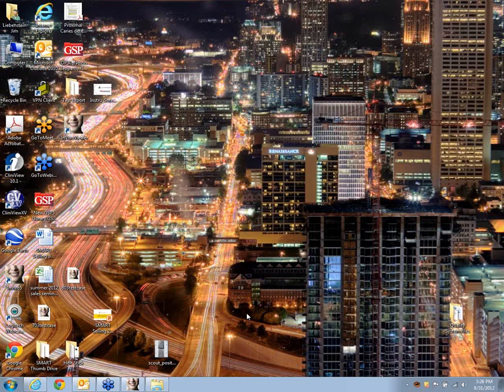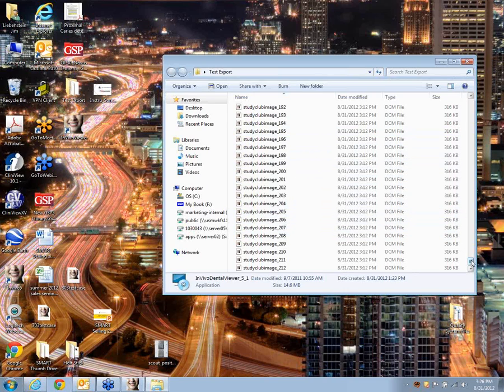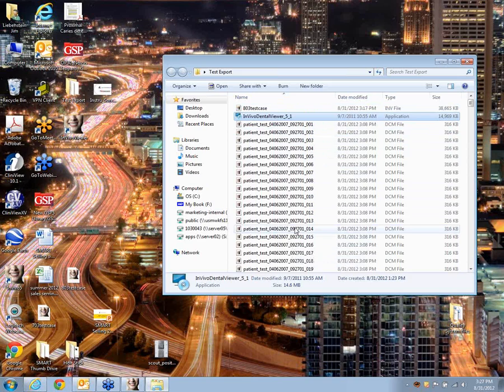If we are sending out objective information, the data set itself, without all of your comments on it, then probably the best way to do it is to export a DICOM CT file. And the DICOM CT file can take two forms. It can either be the DICOM CT version, the old school way of saving these, which is really in essence several hundred files, or you can use the newer DICOM format of the enhanced CT, which is a flattened single file that's quite large and it contains all of this information in one file. And depending on the receiver's 3D software, they may or may not be able to use that. So you're always best served by sending out the DICOM CT file, which is these hundreds of files.